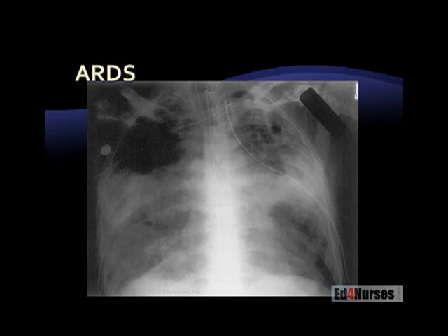Lastly, now this patient has ARDS. You see just kind of a whiteout on the chest x-ray going on from top to bottom. Again, a PA picture. You notice you don't see the heart very well because we're looking from the back toward the front. What is going on there in the upper left-hand part of your screen? Interesting, isn't it? Big black hole, that should be a big black thing that should be air there, right? Except, notice, you see that little white line going through there? That's one of your EKG leads. That's missing too. This is a defect on our chest x-ray.